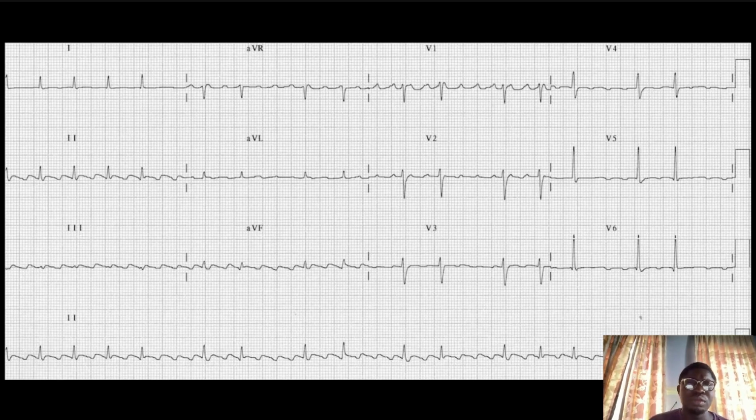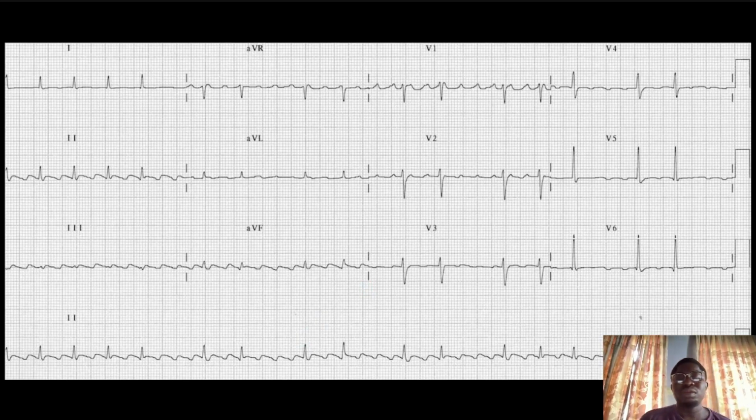All right. After that, we have to try to locate the PR interval. But remember, I mentioned there is no P wave, so we can't have a PR interval. So PR interval is absent. Same as P, we can't find P because there is no P wave, P duration, we can't find it. The best we can do is compare QRS complex.